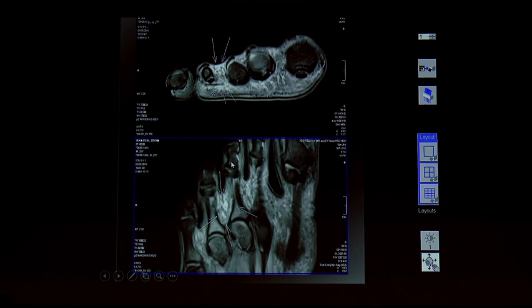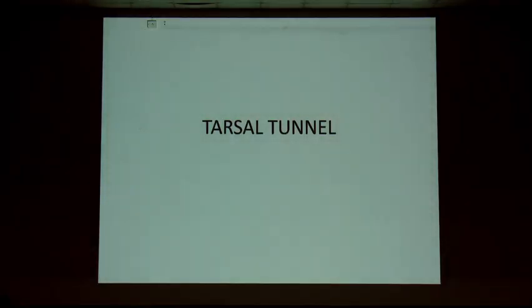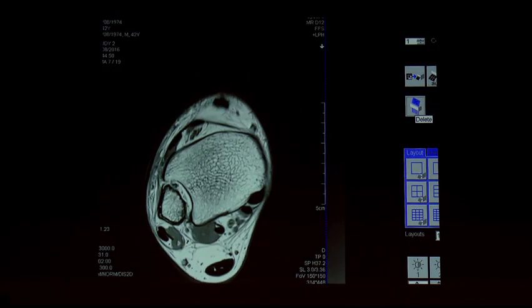This is another case. Classically, how we have to look: it is below this intermetatarsal bursa. We will see it. This is the typical area where it will form. It is perineural fibrosis. It is not a neuroma at all. Tarsal tunnel anatomy: carefully look for these three structures.